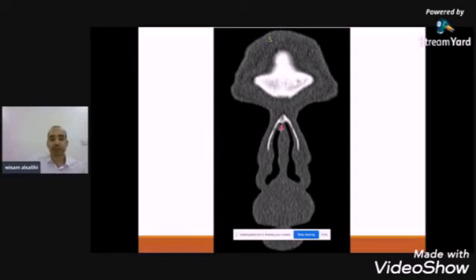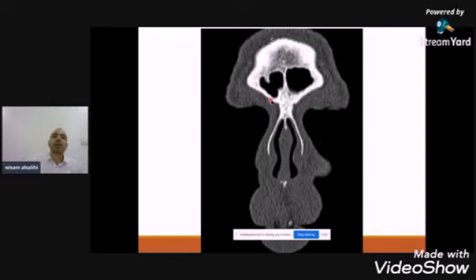The first cut shows the nasal septum, cartilaginous, partly thickened, and this is the nasal bone and the frontal bone. The second cut shows the frontal sinus appearing now. This is the nasion, the nasofrontal beak, and this is the nasal bone. The ascending process of the maxilla starts to appear, and the bony part of the nasal septum starts to appear, and this is the swell body and the rest of the septum.